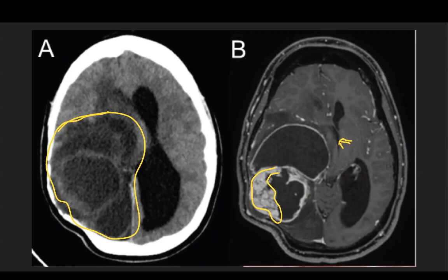Okay, somebody is writing in the chat box, Siafa Sando. So this one is a new name. Pleomorphic xanthoastrocytoma. Yes, we can keep that in the differentials. And Dr. Fatma Javed is saying that GBM wild type just on the basis of radiology. That's right. If I just looked at this radiology, I would bet that this is GBM.